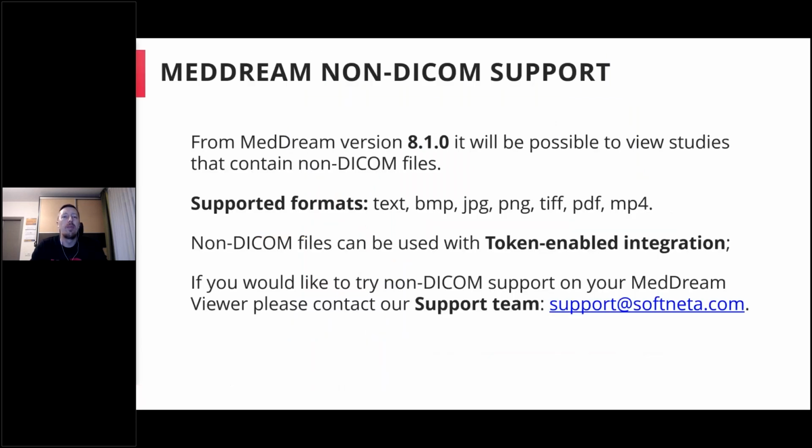From MedDream version 8.1, it will be possible to view studies that will contain not only DICOM but also non-DICOM files, and the supported formats will be text, BMP, JPEG, PNG, TIFF, PDF, and MP4 files. And these non-DICOM files will be available if you will be using the token-enabled integration.